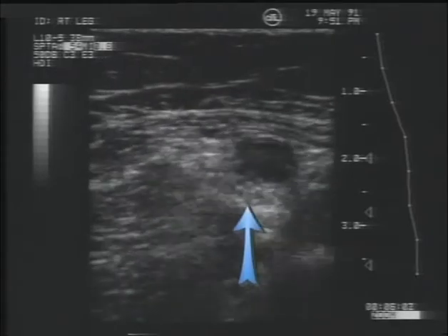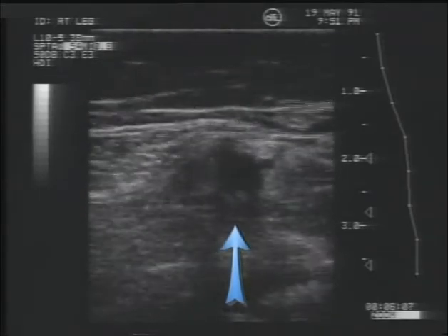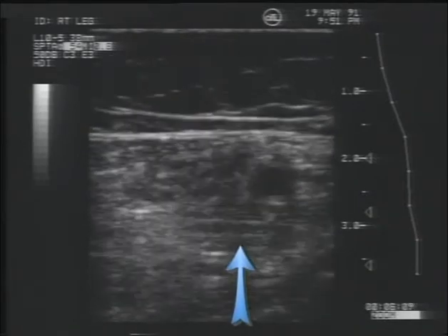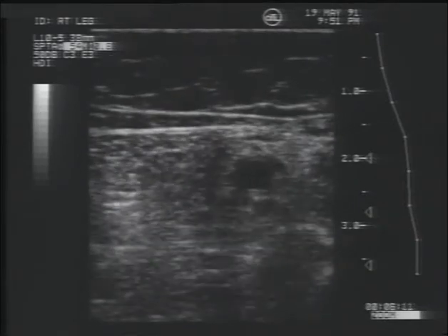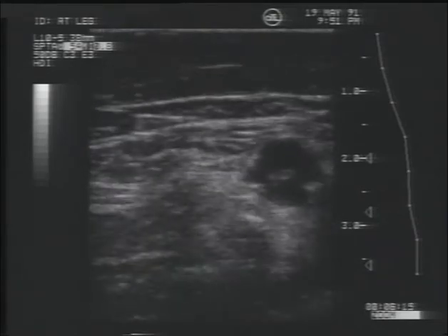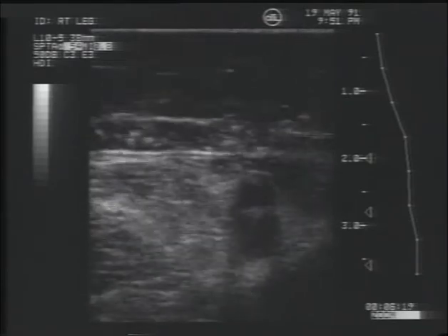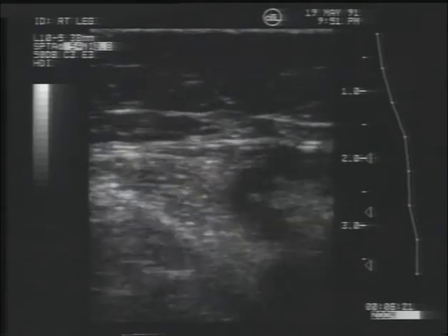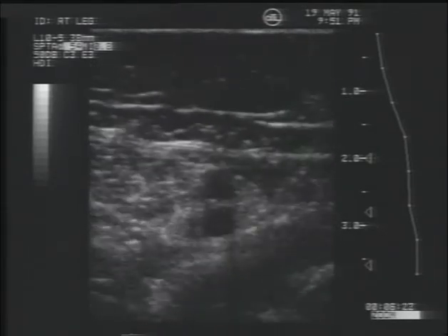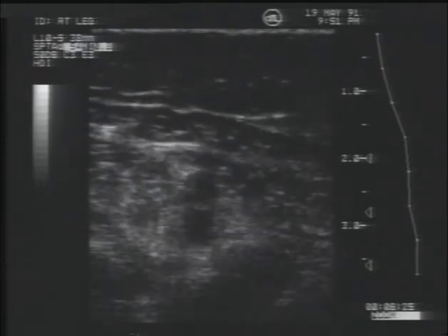If a vein is completely filled with thrombus, and if that thrombus is well attached to the vein wall, the thrombus will take the vein wall with it as the clot contracts. This continues with time until the vein is small and contracted. This process, along with the brightly echogenic appearance of the remaining thrombus, further contributes to the disappearance of the vein during the chronic phase of venous thrombosis.